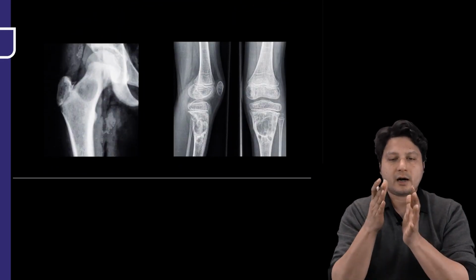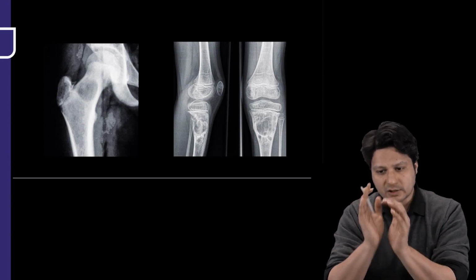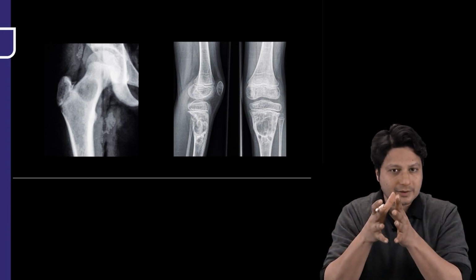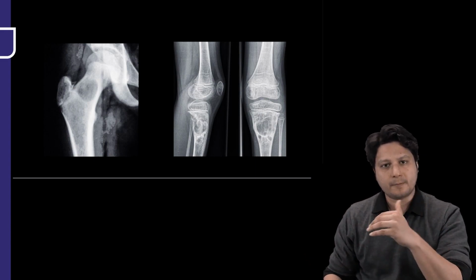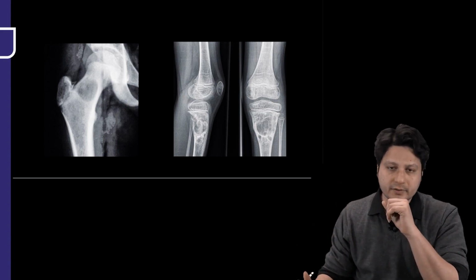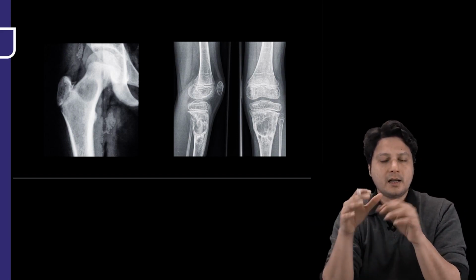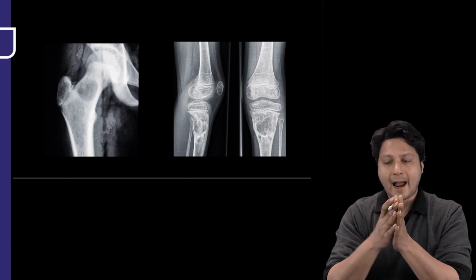Now, there are two cystic lesions that we have talked about. One is a kind of cyst which remains confined within the normal cortices of the bone to a longer extent because it is gradually expansile. On the other hand, there is a kind of cystic lesion which goes beyond the confines of the normal bone by thinning out the margins of the cortices. Point number two, one of the cysts is clear without any septations or fragmentations. On the other hand, the other kind of tumor has multiple septations, multiple fragmentations and loculations.